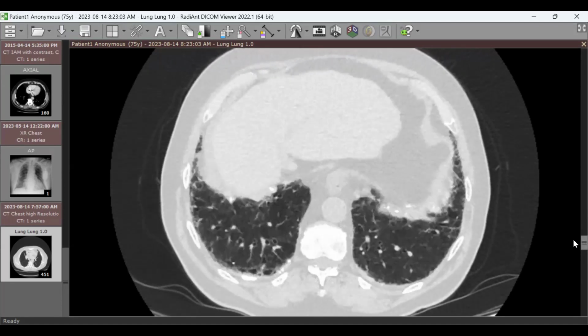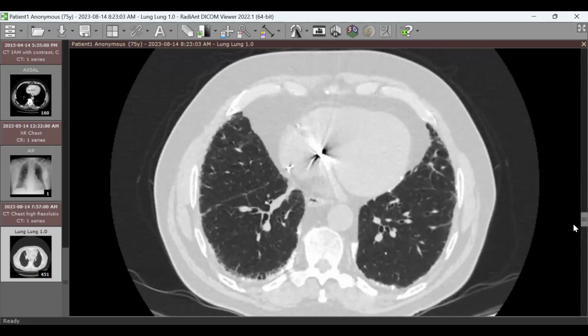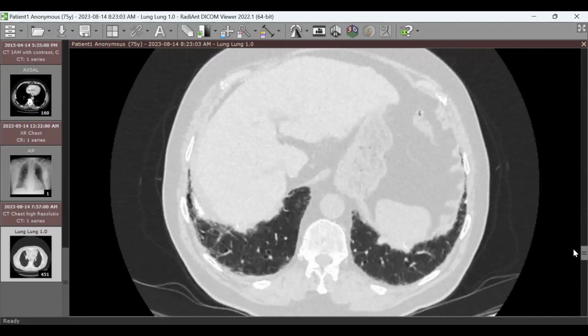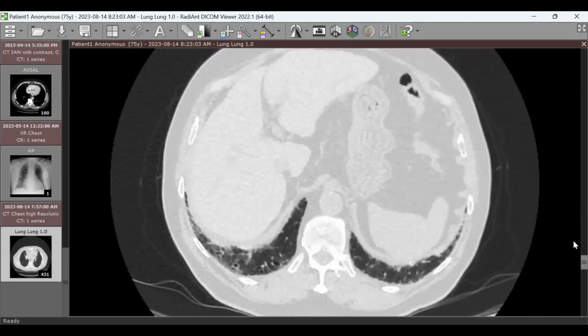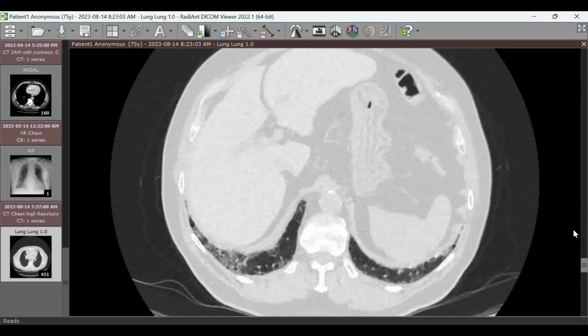Exactly. In this case, we have honeycombing, bilateral, more predominant in the right lower lung base, and also multiple atelectatic bands, fibrotic bands. We have the third element, which is the traction bronchiectasis, more predominant in the right lower lung zone. What about the distribution? Also the left lung base, but more predominant in the right lower lung base. Also have the calcified plaques.